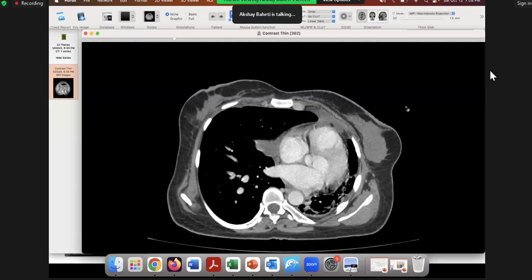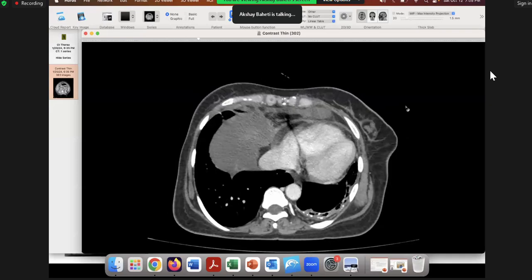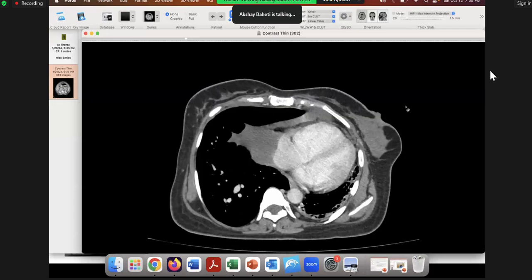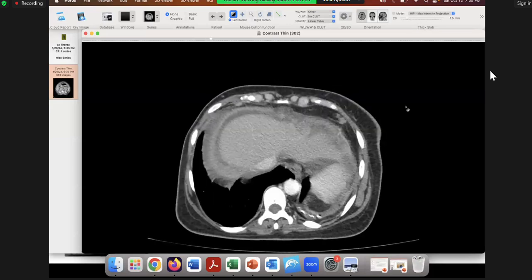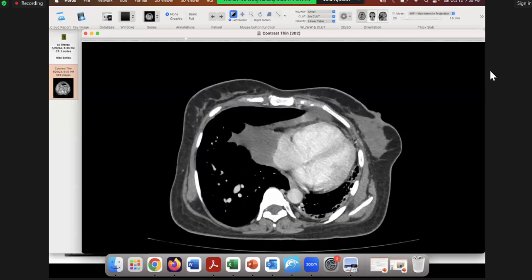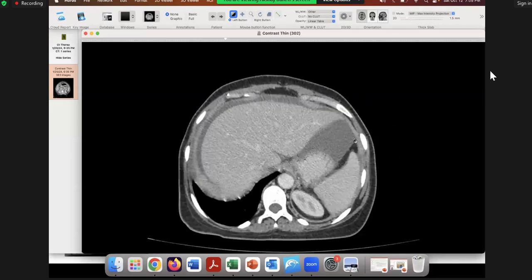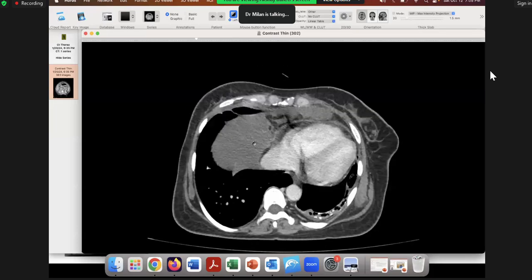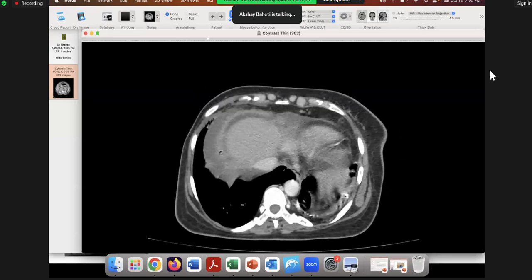So we'll go down further. And so give me some positive finding apart from the fibrobronchiectatic changes in the lungs. Is there anything abnormal in the chest? So what's that? What do you think is this? That is the liver on the lower section, sir, and there is fluid. There's some fluid, right? So what is this? Yeah, this is the liver. What do you think is this? What is this structure? That is the diaphragm.